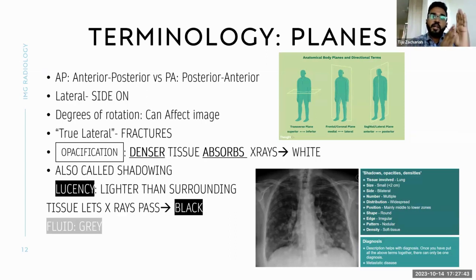In between, there are multiple structures that will help us assess a lot of things within an X-ray. What are those things? Immediately after air, we have fat, and after fat we are going more white. So air, fat, subcutaneous tissue or even fluid, and then comes bone, and then comes metal. This is the scale which helps us to read different things within the X-ray.